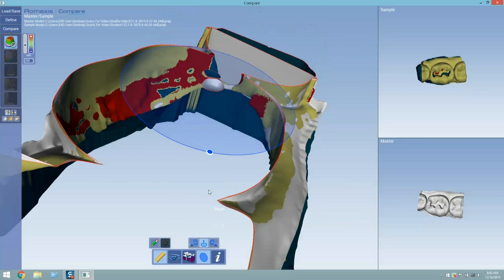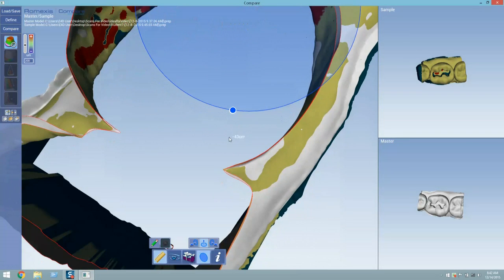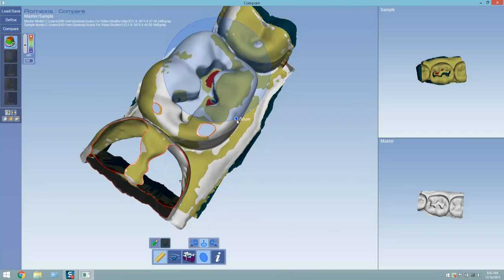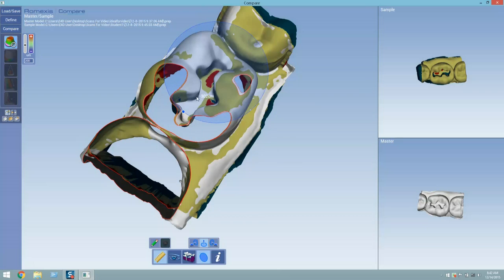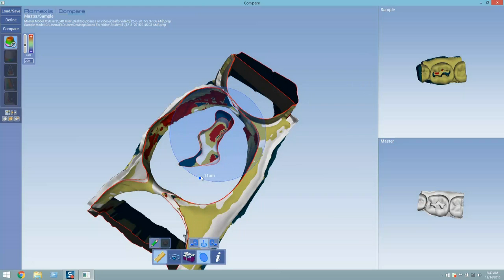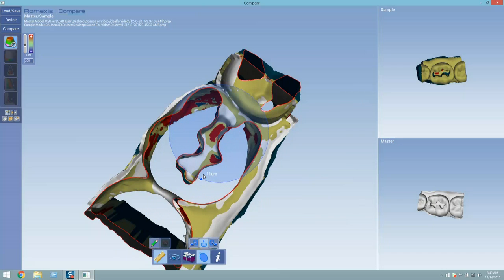The occlusal slice plane allows us to take an accurate measurement of the isthmus width. Again, using the measurement tool will allow you to measure the isthmus width at the appropriate places.